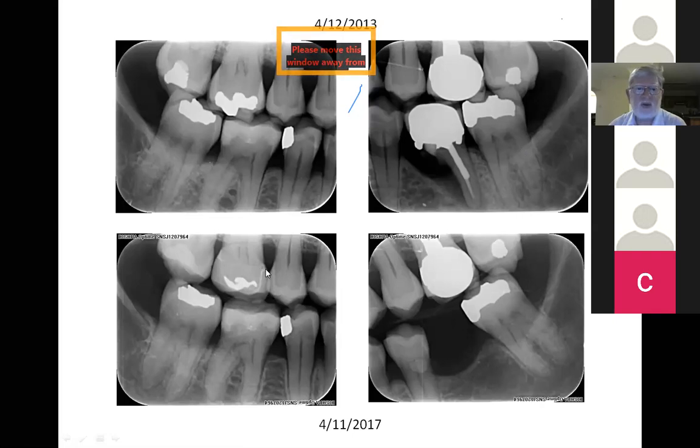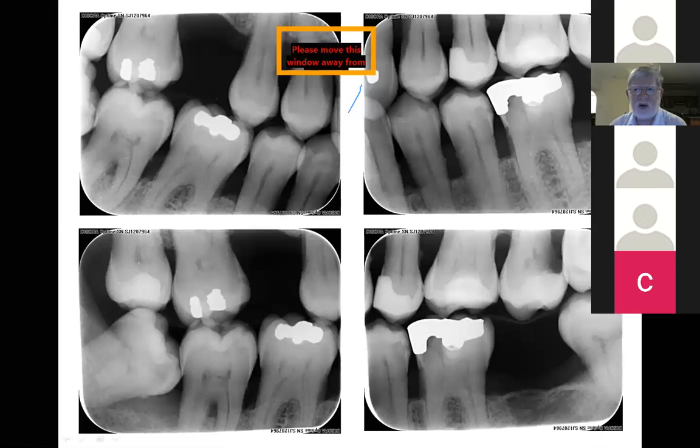You can make out the cement lute all across there. Yes. That tooth, although it had a relatively small amalgam in it, had many crack lines in it, no symptoms, and we preempted a problem by crowning it.